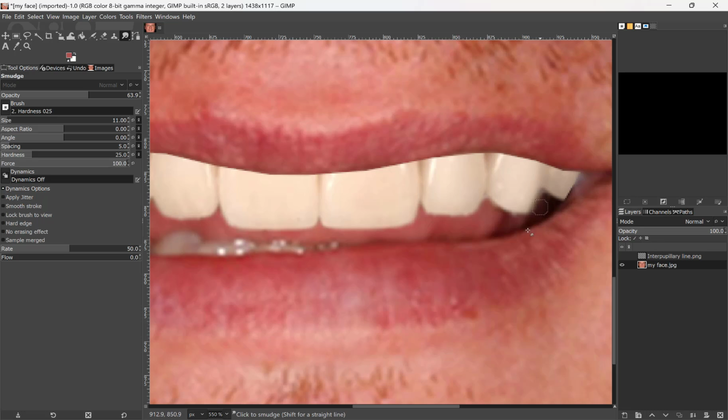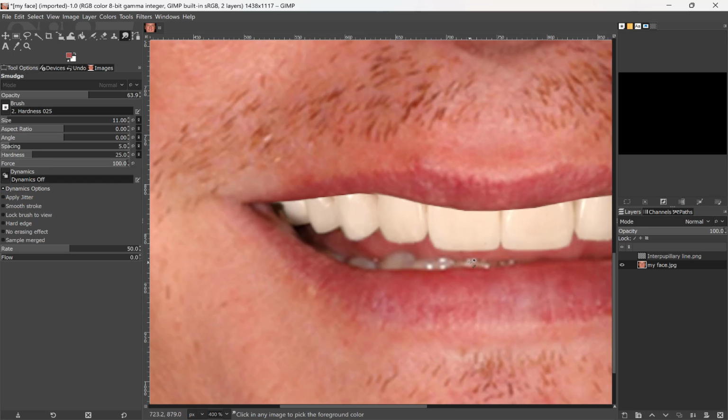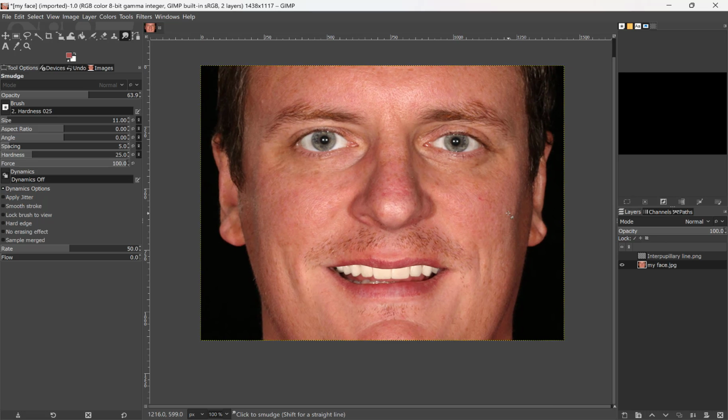And then too, if you've got any harsh corners, like you can see where my mouth cutout ended, you could just kind of blend over these a little bit. If anything just looks like it's a little too sharp, then just blend over it. All right, so that would be, in my mind, a really nice simulation.